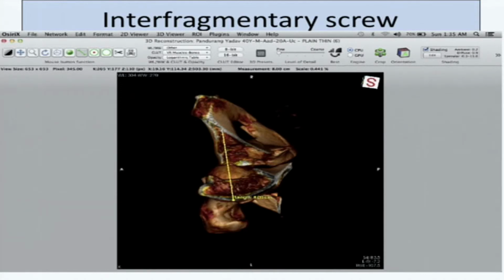That is particularly useful during the surgery. If my length is grossly wrong, then my screw is not in the proper trajectory, or I have not done the proper job. Maybe it is not going in the right trajectory. So if I know the proper length preoperatively, that gives me some information intraoperatively to judge the accuracy, other than the intraoperative C-arm that we are going to use. So we can take the separate length, and there we can calculate the length of the screw.